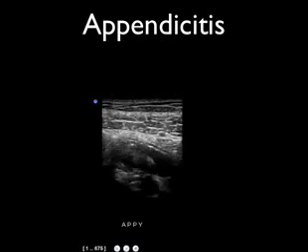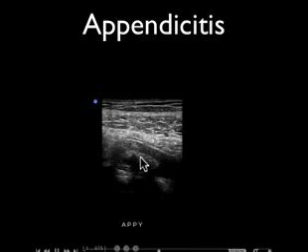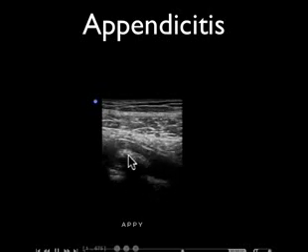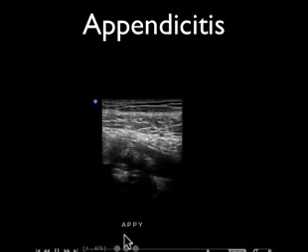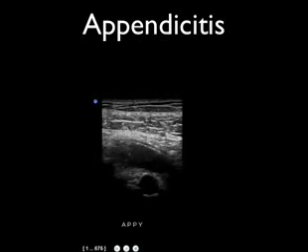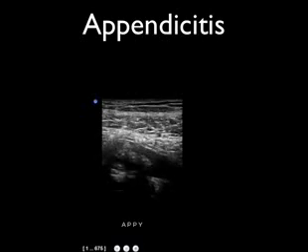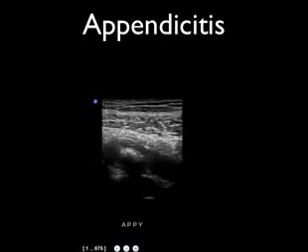This is just another example here of appendicitis. Here we can see a fecalith, or a poop stone, in the distal appendix causing a shadowing here, and that's nice when you can see them. It's kind of rare, but when you see one, it's pretty cool on ultrasound. It looks just like any other stone does, kidney stone, gallstone. Otherwise, it exudes some shadowing.